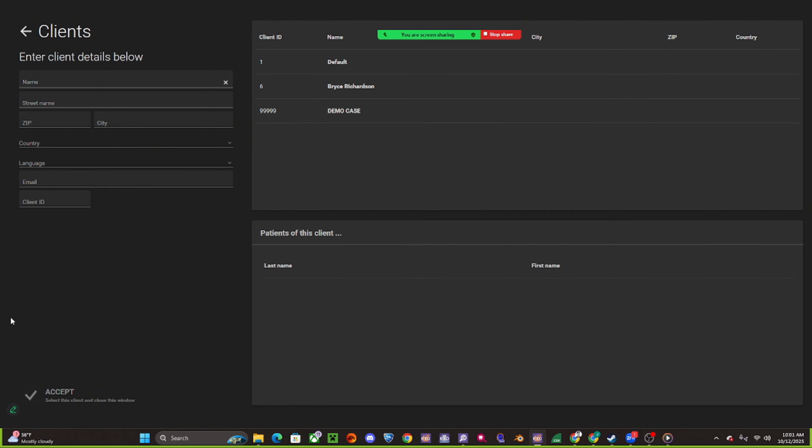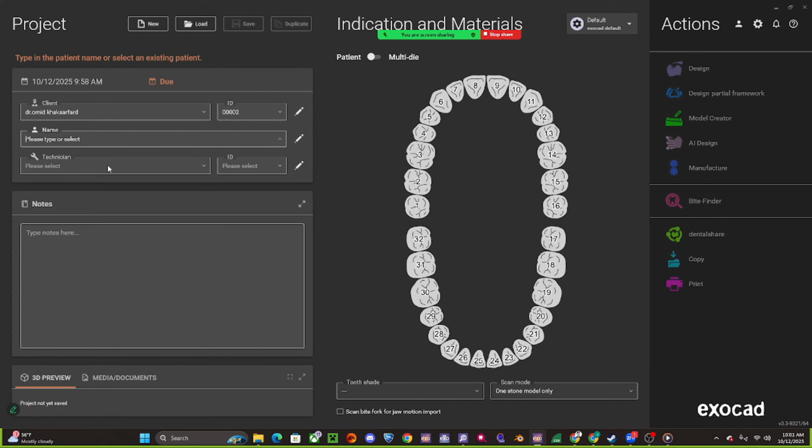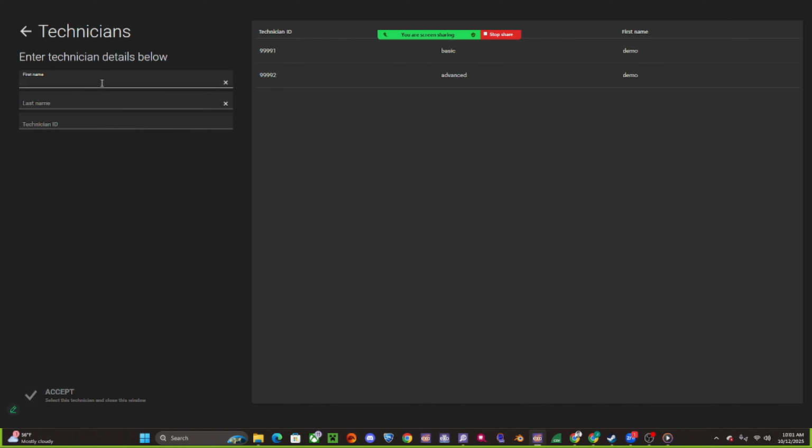I'm gonna enter Doc over here as a client. And then new, and then our patient name, we'll just mark him as, what's his initials? RM. Patient RM, and I am the designer. You can mark your designer in here, so we'll do Johnny. If you don't have it, it's just for organization.